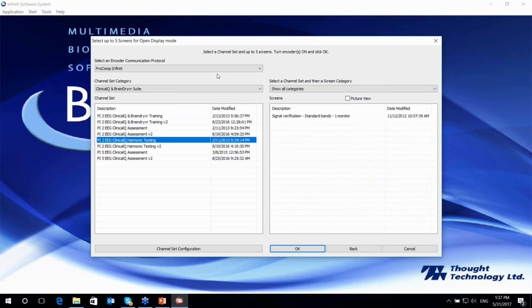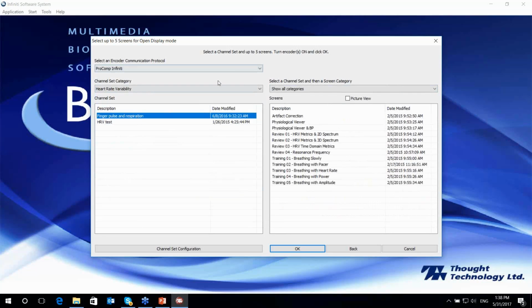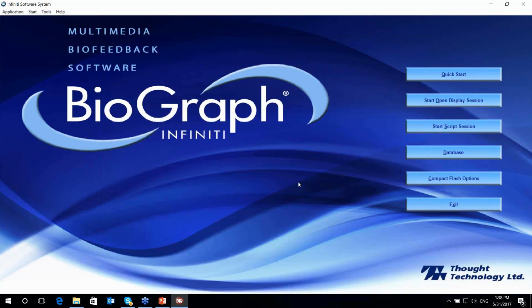In creating this quick start, we're streamlining this process, where we tell the system already which of these selections we want to choose and exactly what is of interest to us. Just remember that when you go through the quick start selection process, it's pretty much just asking you to fill in these choices for the system immediately so that at a later time you don't have to bother thinking about it again. So knowing this, let's jump straight into getting started with the system.